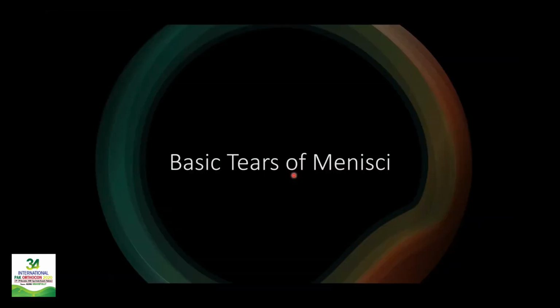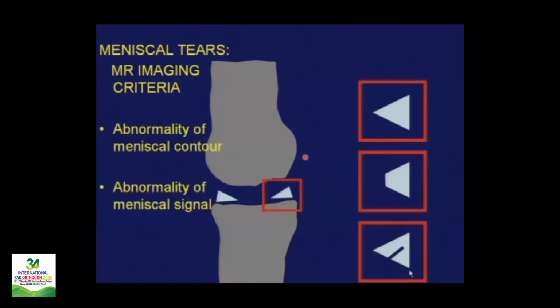So now, starting with the basics of the tears of the menisci, this is the same image. For a tear to be called a true tear, there are basically two criteria. One is that either the shape of the meniscus is abnormal, like in this image, or there is an abnormal signal within the meniscus. So for example, if you see this image, there is a disruption of the normal tapering of the meniscus. This can indicate a meniscal tear, and if abnormal signal is reaching the surface.